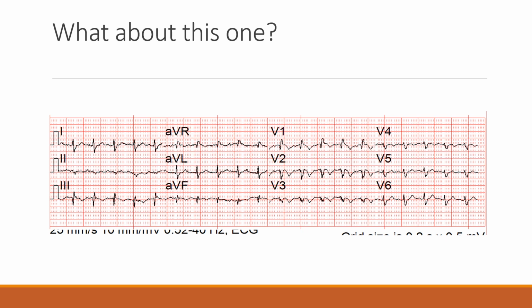Now, I have a whole episode on some of the other things on this ECG, and I don't want to tip it off just yet, but there's also some other abnormalities. Your T waves are down. They are all pointed down in V1, V2, V3, and lead 3. That's really ominous. V6 is negative. You have an S wave. That's not good when you have these other things.